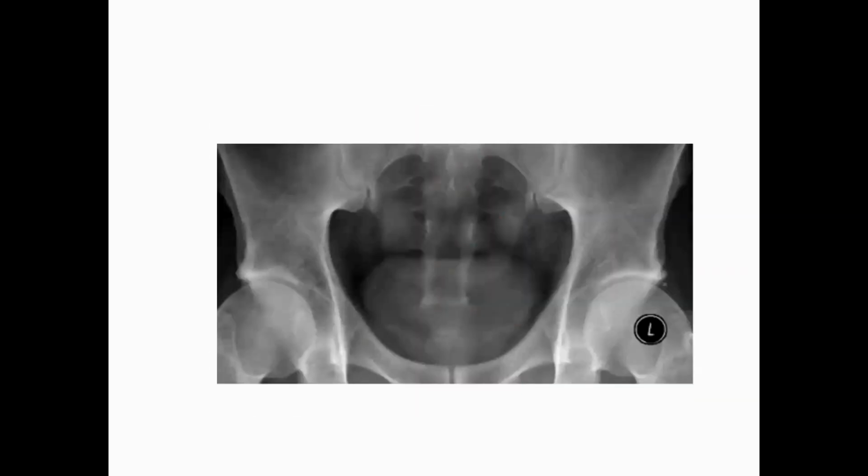Okay, here then after that you're going to see the bladder. So this is the bladder. The bladder has a variable appearance, because it depends on how full it is. So it has the same density as other soft structures. Why? Because of its water content.